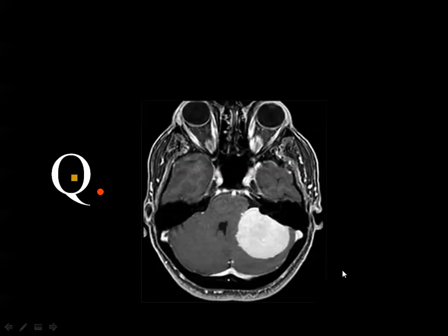The lesion is extraaxial as diagnosed by widening of the ipsilateral cerebellopontine angle cistern. If this lesion is centered to the orifice of the internal auditory canal and extends inside it, you may think of acoustic neuroma, which is the most common enhancing cerebellopontine angle lesion. But if most of the lesion bulk is away from the internal auditory canal and is based to the dura, which is typical of meningioma.